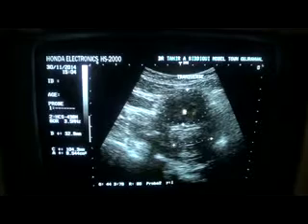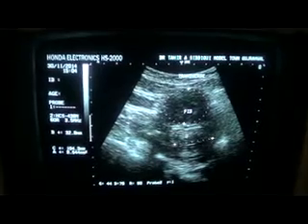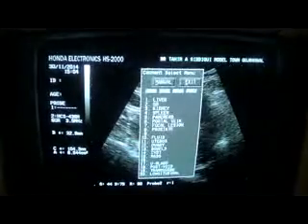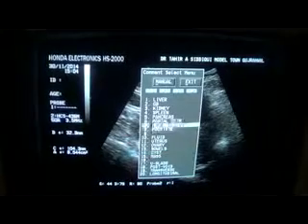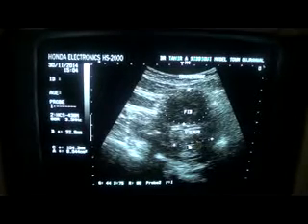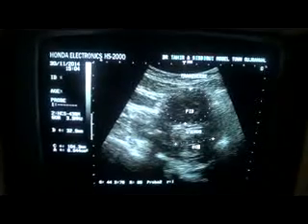These cystic areas are representative of internal degeneration. So the largest fibroid relates to the fundal region, is pedunculated, and has internal areas of necrosis or degeneration. And what else? Well, yes, this thin linear structure is the endometrial canal.